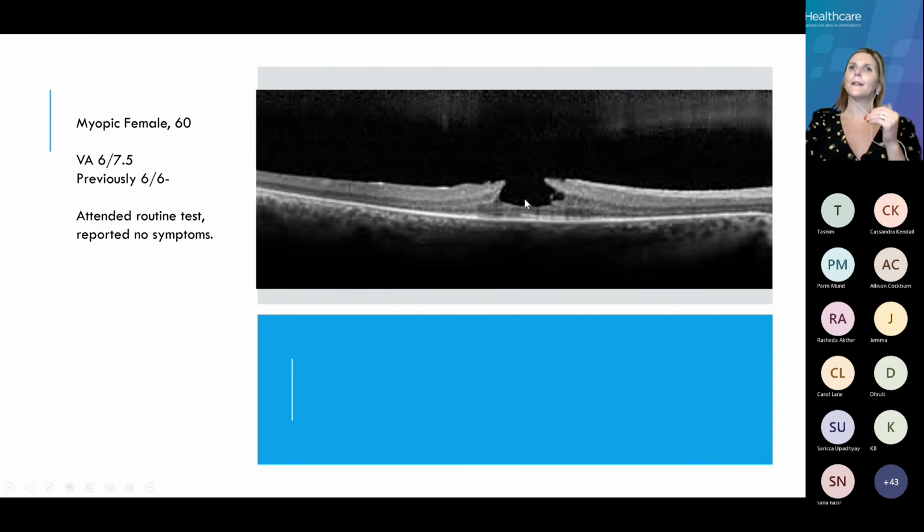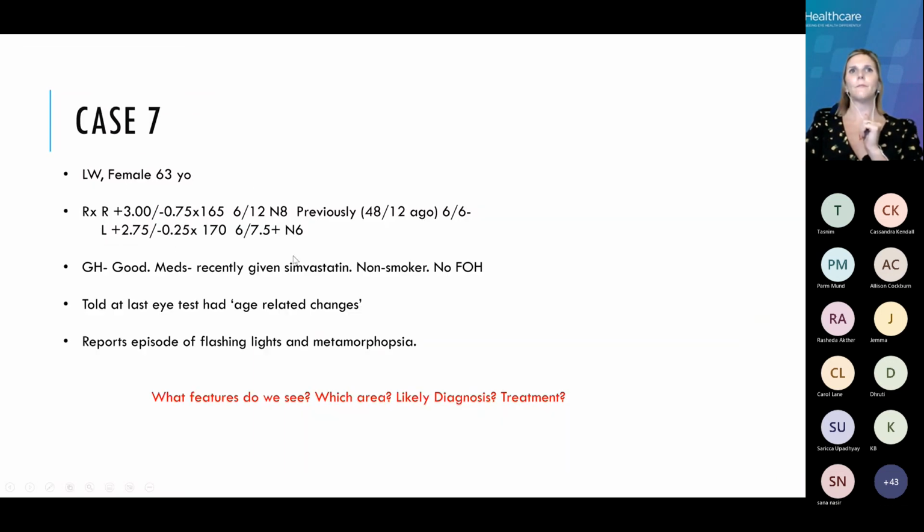If they've got a macular hole and it's still got the posterior hyaloid layer attached, it could continue to grow. And there's 4 stages of macular hole. So, you know, we may look at them and we can change that as we go through. So really important just to look at those signs and symptoms.